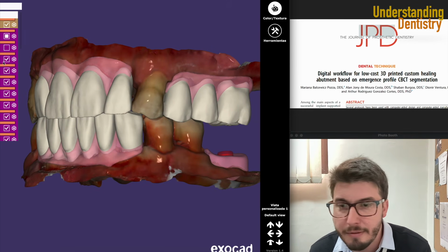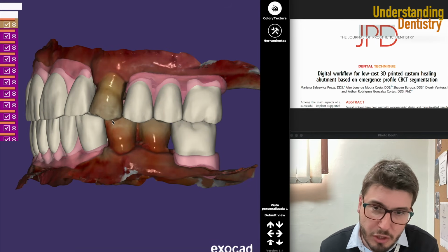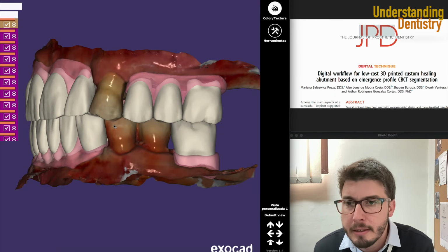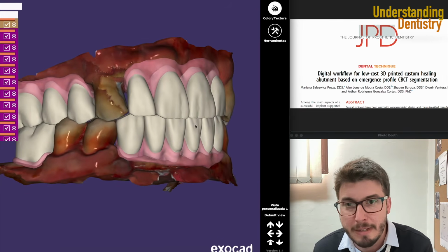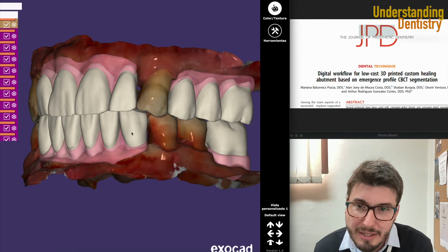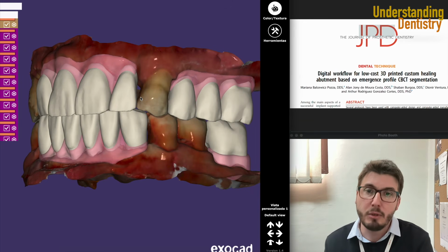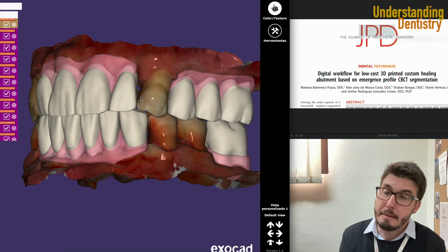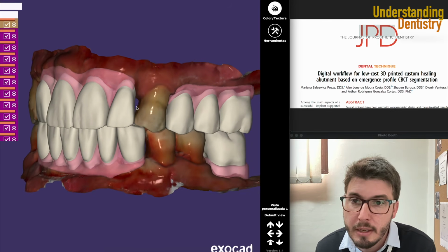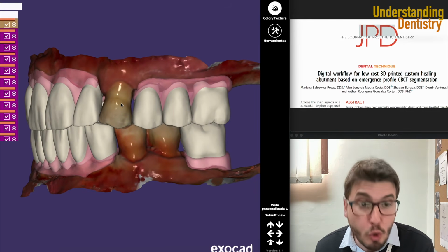And then finally we have the molar of the other side, occlusion finishing on the 6th, and of course that's standard stuff. If you still want to remove these other teeth, then this would be just a step of the treatment. Then you would include these teeth later. Maybe you are doing just a temporary prosthesis for a specific situation. So we are just assuming here because we don't have the CBCT. But the occlusion is nicely planned.